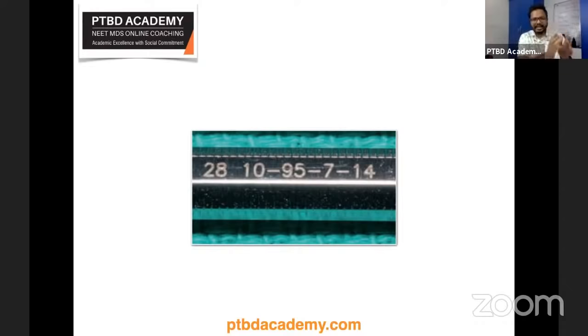What does this 28 represent? Can anyone say what this 28 represents and whether it has any significance? In some instances, an additional number on the handle is the manufacturer's identification number. These identification numbers are included to assist specific manufacturers in cataloging and should not be confused with formula numbers. Not so significant for us, so just keep in mind that these additional numbers represent the manufacturer's identification number, right? I hope it's clear. Any confusion whatsoever, let me know.